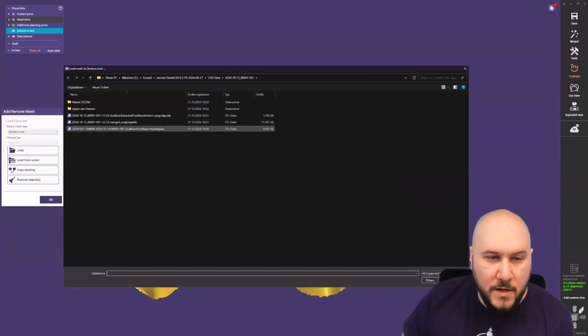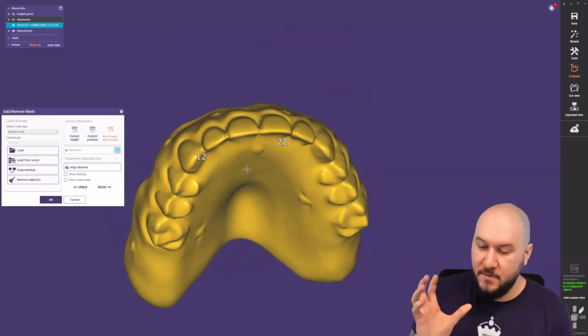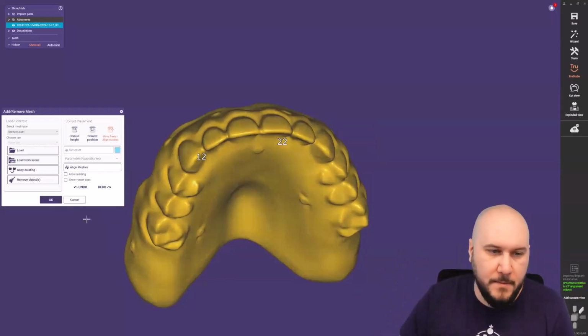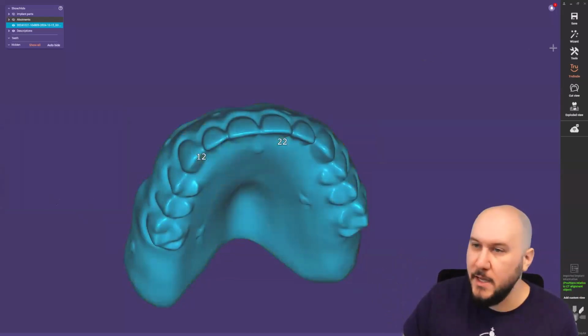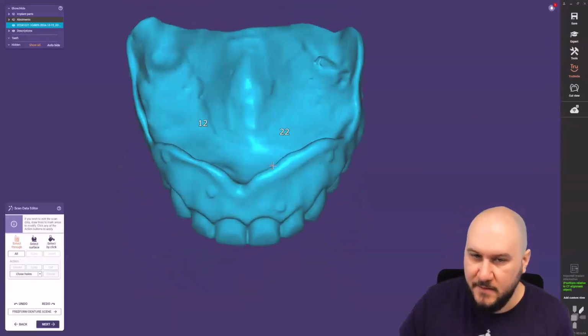And now we need not our merged surgical guide. We need our dual scan prosthetics implant planning. So now we just switched out the prosthetic base with our full denture. Okay. I can click OK, and I can go on wizard again. And I'm exactly in the step where I just entered.